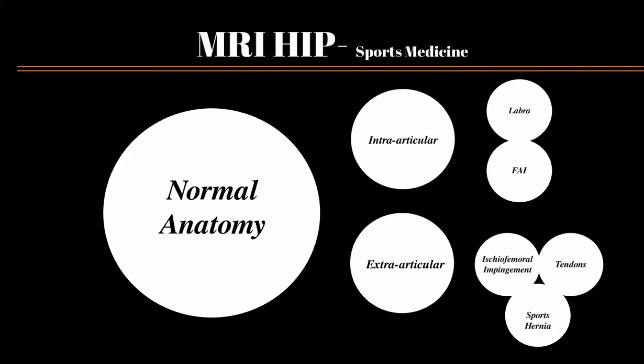I'm going to show you some MRIs of sports-related injuries. Pathology like osteoarthritis, tumours and infection I am not going to include. It's important to stress at this point that you are not expected to make a diagnosis on your own. There is always your friendly neighbourhood MSK radiologist there to help and even treat some of these conditions. Now, in order to appreciate the pathology on an MRI scan, we need to have a basic understanding of normal anatomy.